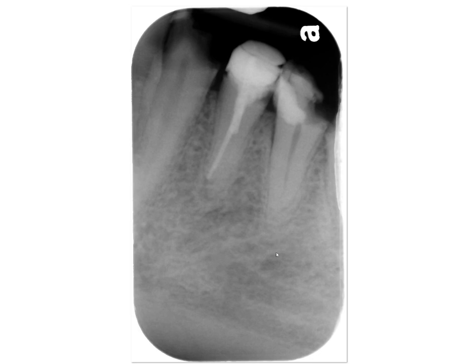Mandibular periapical radiograph, inferior cortex of the mandible. You can see the cortication of the mandibular canal, and somewhere in this area we have the mental foramen, but I think it's really hard to say where that's located. This increased radiolucency may suggest this is where it is, but I also see radiolucency that extends posteriorly, anteriorly, and extends up, such that this may also represent a mental foramen.